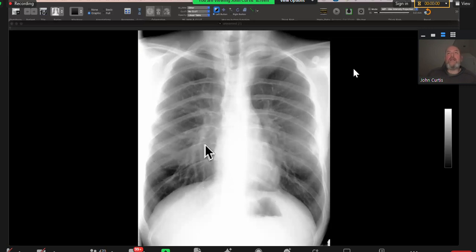Okay, if that's coarctation, what's this thing here? What's that thing there? Okay, so these are basically pleural-based lesions that are making an obtuse angle with the chest wall. So these could be neurofibromas. And so why can't you see the neurofibromas causing the rib notching here?